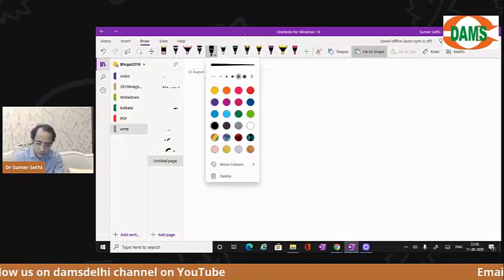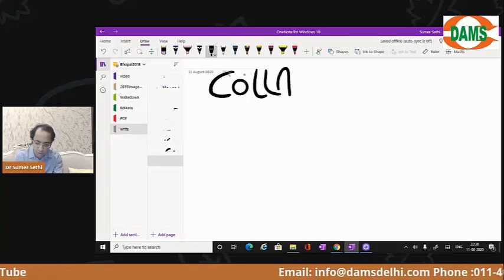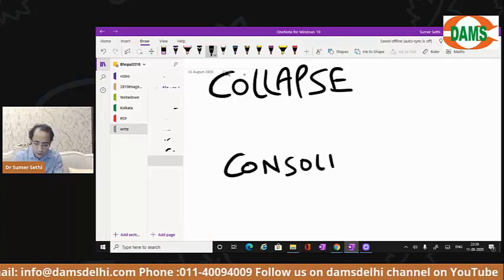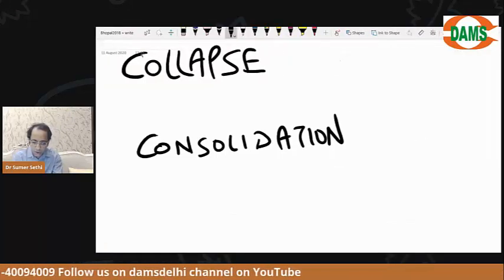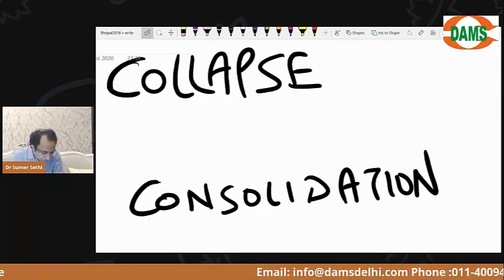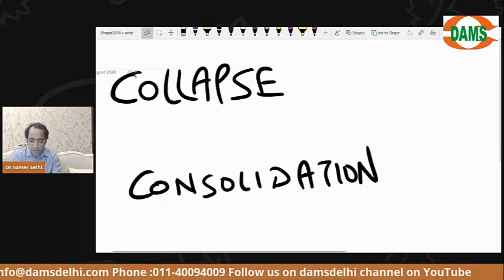In chest X-ray, we often use the words collapse and consolidation. Have you heard of them before? Now see if you can answer.